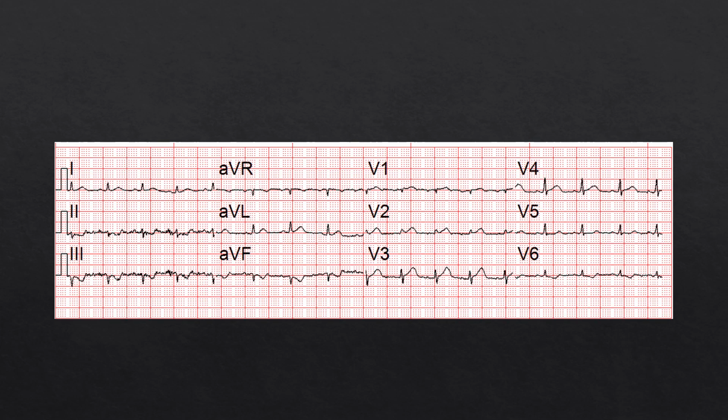So you've already seen this ECG. I was talking about this with hyperacute T wave. So this was a patient who presented with chest pain, classic symptoms, but they really looked very ill. But the ECG, like I said, wasn't overly obvious. It just didn't match the patient quite. But the providers took repeats, thankfully.